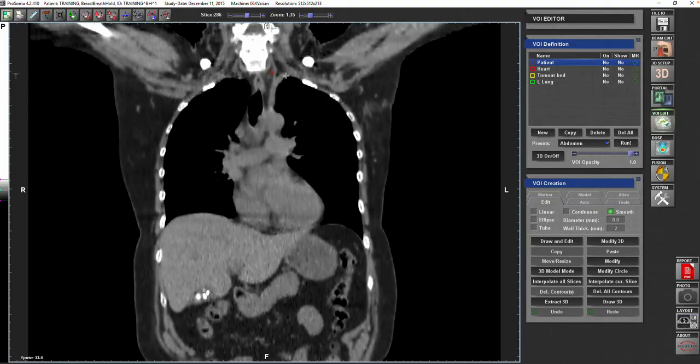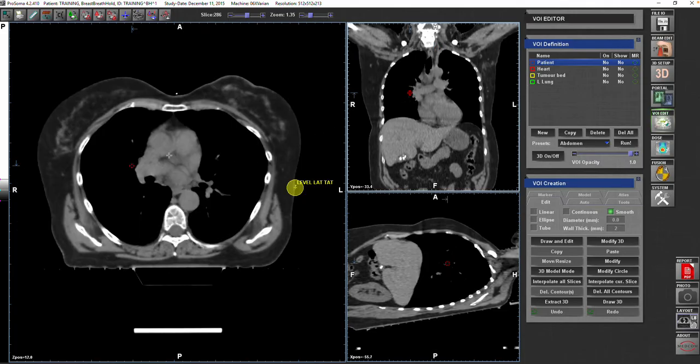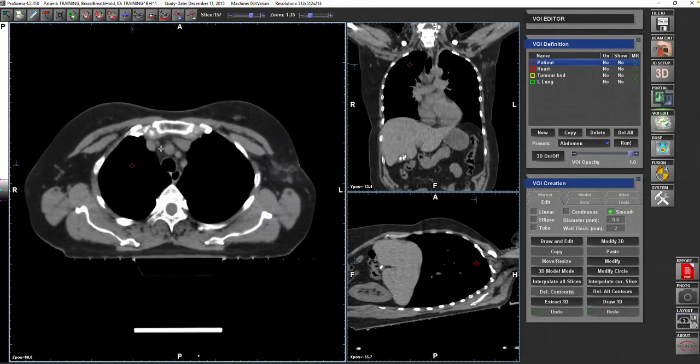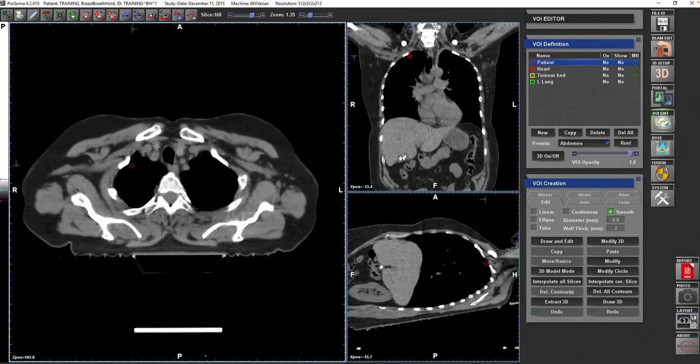So you have to familiarize yourself with the subclavian arch, and I'm insisting on saying artery because there is another arch that looks pretty much the same, and I will show it to you more anteriorly; it is for the subclavian vein. But for the artery, you can never miss it, because you are following the artery from the arch of the aorta up to the subclavian. Then the subclavian arch will appear. The right side is very similar, but you just need to follow the brachiocephalic trunk, because on the right side it gives us the subclavian artery.